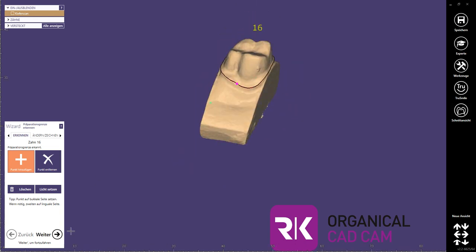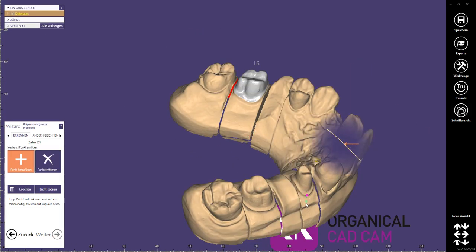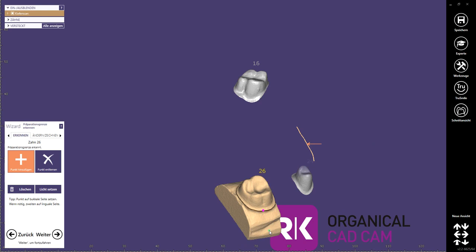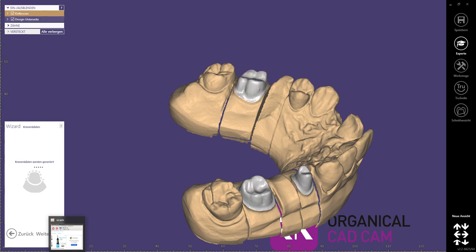So it works also if I stay as an inlay, but it's much easier to change the order and continue with modeling my total crown using the single stump scan. I see. Okay. Sure. So that's my trick for using this one.